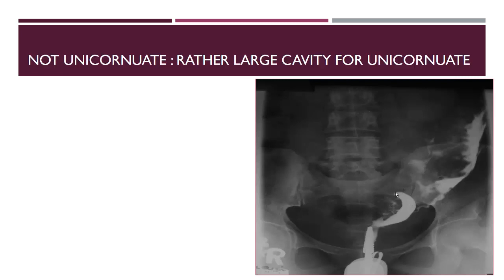But one can tell me, but we see only one fallopian tube. So there is a problem here. Why there is an abnormal contour of the uterus and it is displaced to the left? Usually the uterus is inclined to the right. So if it is displaced to the left, then this is abnormality.